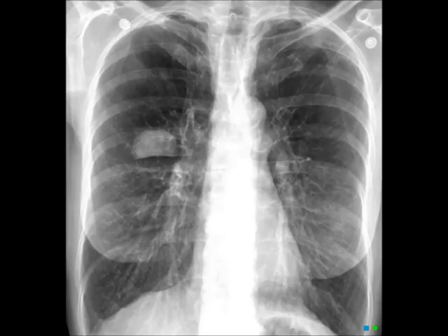When you're examining a patient, you observe the whole patient from the end of the bed before delving into small details, and it's the same with examining a piece of imaging. Look at the whole thing. Can you immediately see any obvious abnormalities like a large lung mass?